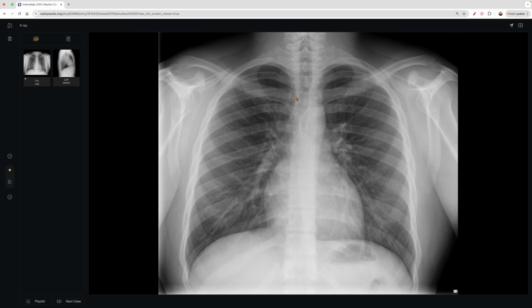For the next cases that we'll have, I'll try to go through a search pattern relatively quickly so we can save some time. In medical school, they teach the idea of the ABCD approach. You look at the airway, that's the A, and next you look at the B, which is the breathing, which would be the lungs, right? Then you look at C for cardiac, which would be the heart, and D for the diaphragm, and then E maybe for everything else, whatever the case may be.